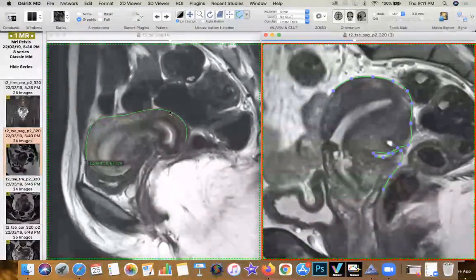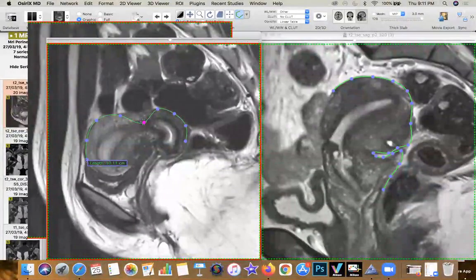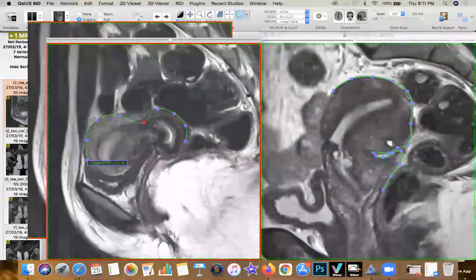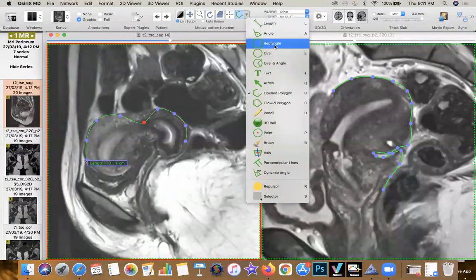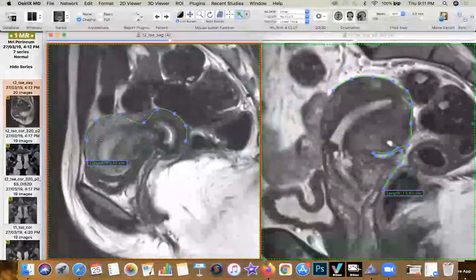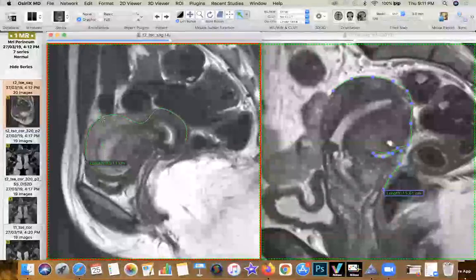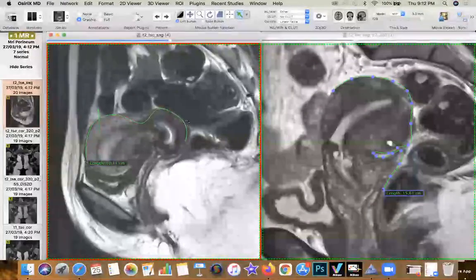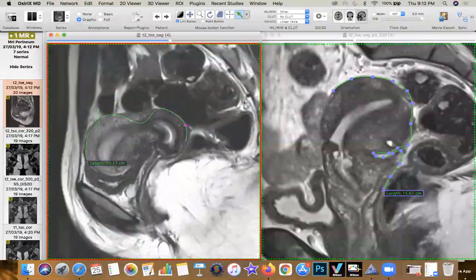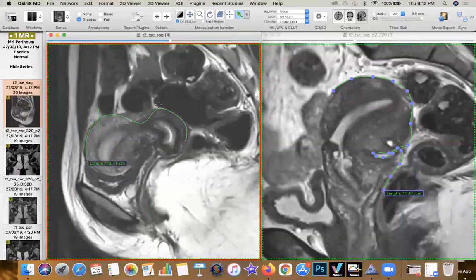So what I had taught you on the previous study, on the initial part, that if suppose there is something which is dipping the contour in, it's going to cause the fundus to move in a different direction. So if I were to show you which way the fundus would start moving, the fundus would move upwards. So the fundus, instead of being low, is going to be pulled up here because of the tug sitting out here. And at the same time, the posterior fornix, which is located here, is going to move upwards as well. It's going to move in this direction.